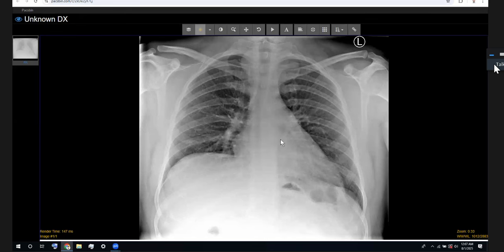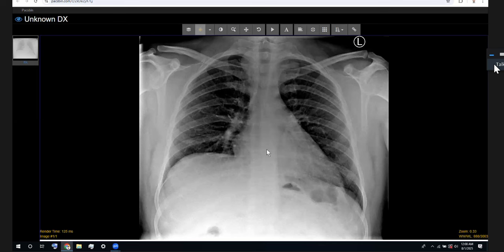So provided is the frontal chest radiograph in a young adult with history of chest pain. I'll just take a moment before I comment. The first thing I can notice is a well-defined semicircular opacity seen in the right paratracheal region. The lateral margin is well defined and the medial margin is obscured. There's no significant associated tracheal narrowing or tracheal shift to the contralateral side. Both lung fields are clean, right?